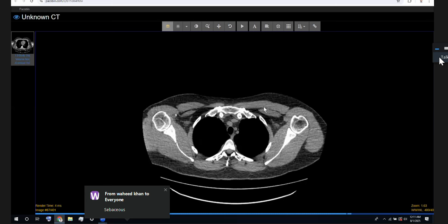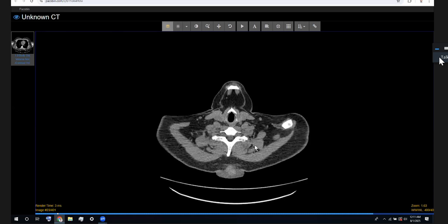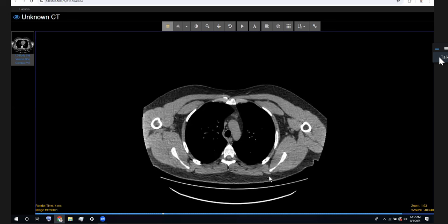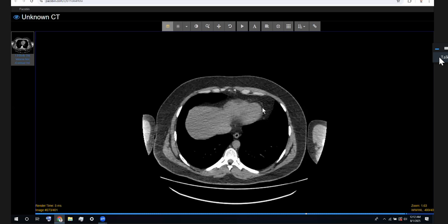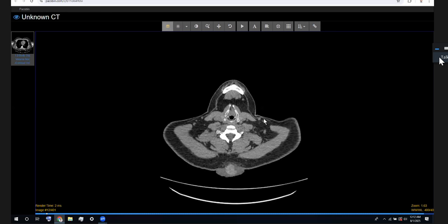So this is an interesting case, because you see the chest X-ray and you worry. You think, oh my gosh, what's happened in this 30-something-year-old? It's new-ish; 6 months ago the chest X-ray was normal. I put alerts on the chest X-ray report, and I even spoke to the A&E doctor who'd referred it. I said, there's something going on here, we need to get him into CT urgently. And this is what it turned out to be, a cyst on the back, which they hadn't put two and two together.